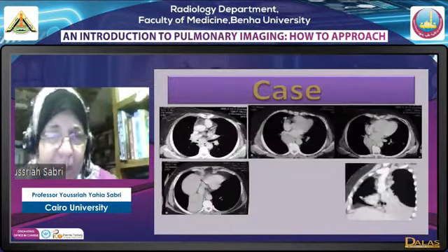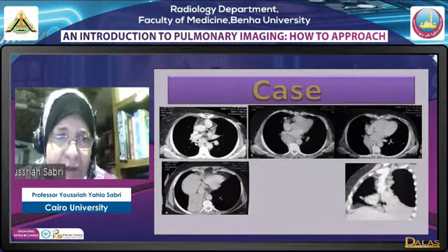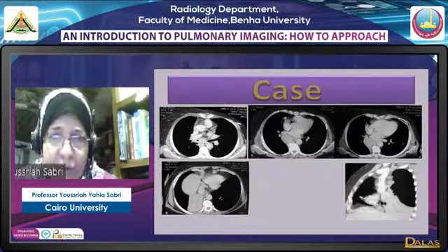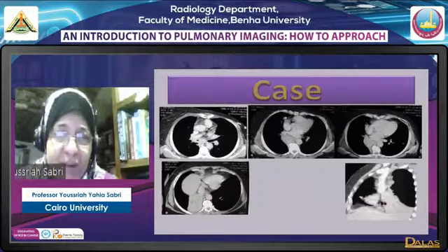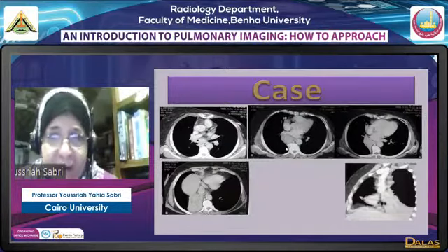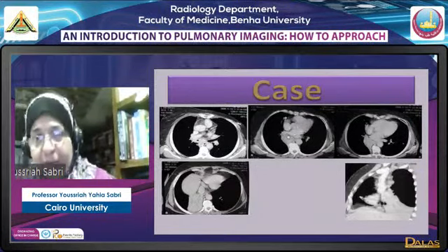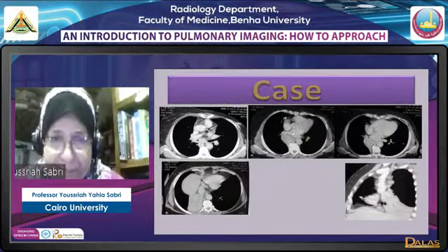Now, the next type of collapse. As you can see here, there is a disfigured, attenuated bronchus intermedius, and at a lower level you don't see it at all. There is fullness in the case of this female patient, who has had a left mastectomy and came for follow-up to see if there is anything wrong with her, and we find this fullness in the area of the bronchus intermedius in the posterior mediastinum.